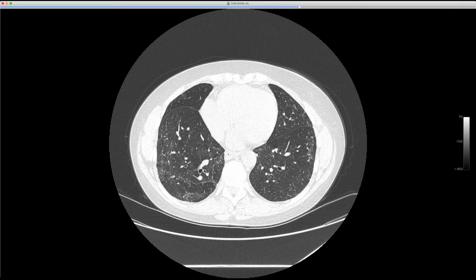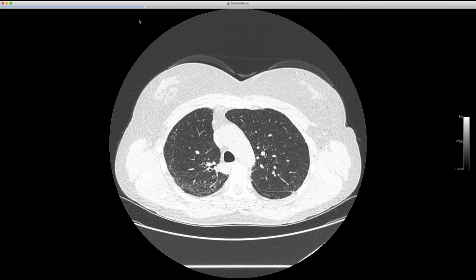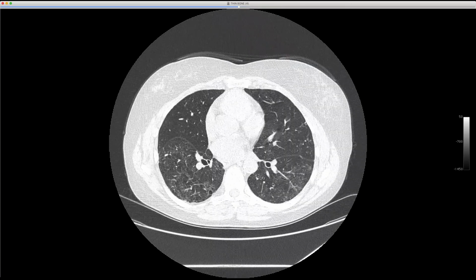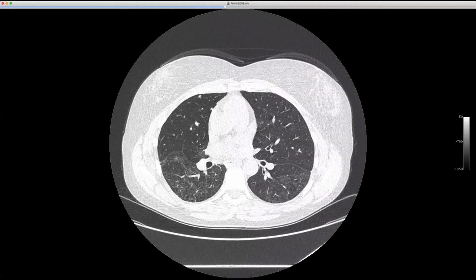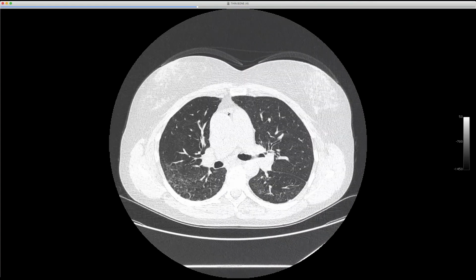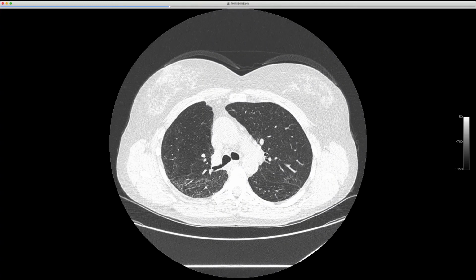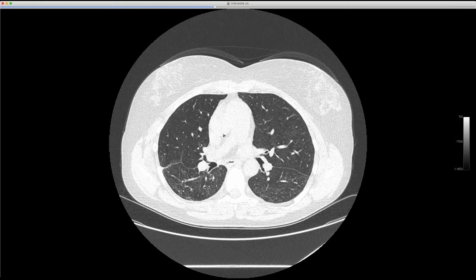But Jeff, do you see it in non-aspiration zones as well? Like we're getting pretty anterior there in the lingula. Not really. I mean, look at that gradient. There's the middle lobe is spared. The tip up there, there's a little bit, but people roll around here and there. He's got these other nodules. I don't know what to make of those, but look at the upper lungs. I mean, it's pristine. Right. That's just my thought.